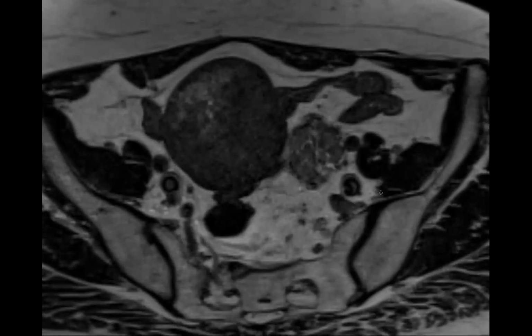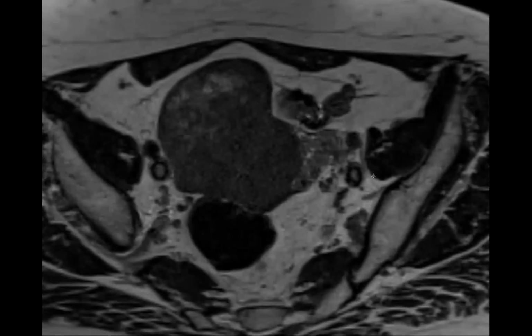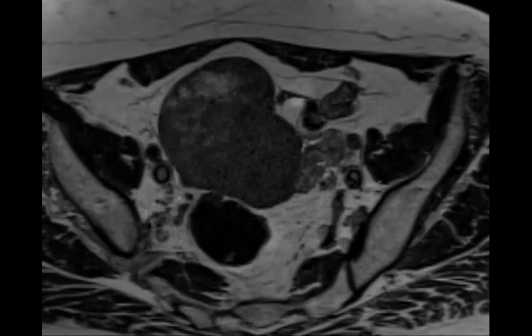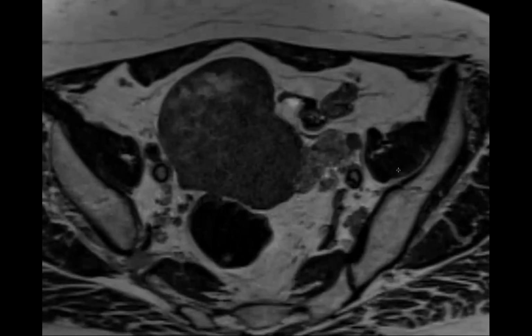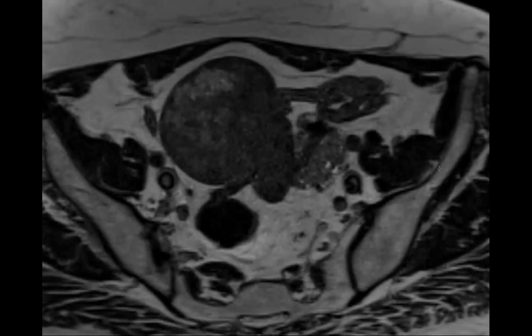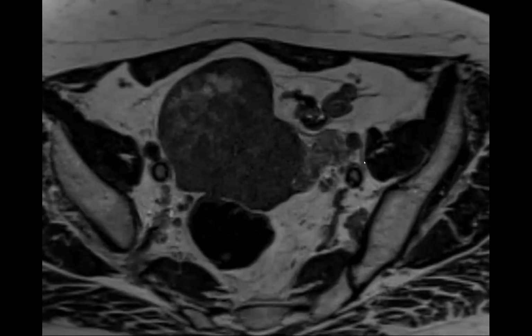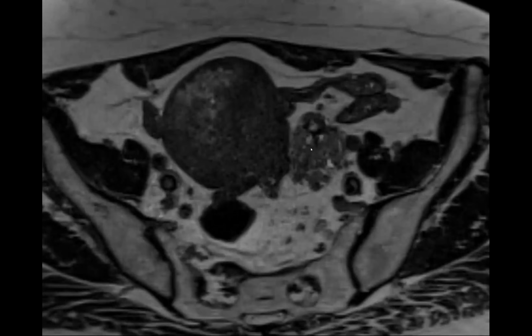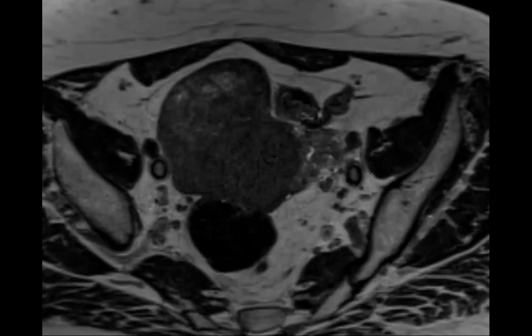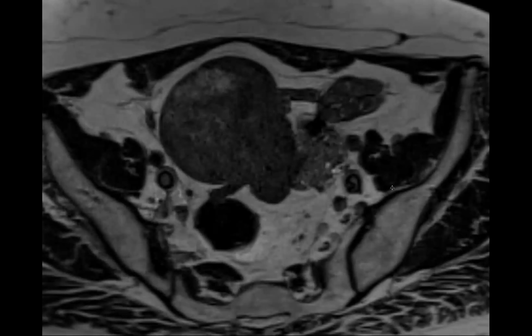But another key here, do you see this little pedicle coming? Oh, the torus. Is the uterus a torus? I'm so confused. Wait, go down. What is that going to? That there is a swirl. There is a swirl. Something's torsed. Well, yeah, isolated tubal torsion.